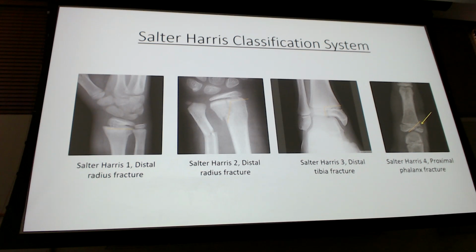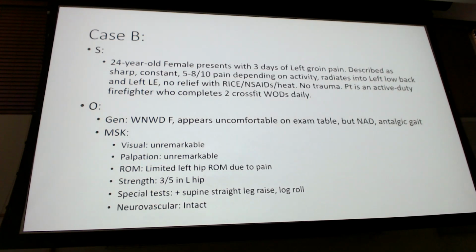We did talk about some like the SCFE and stuff like that, but again, there's going to be more patient presentation or very obvious slippage. I'm not going to give you anything super finite, but really 2, 3, and 4 is where you're going to focus on. You don't need a special patient presentation or anything like that. You can pull that out just from the image. Okay, let's do case Bravo.